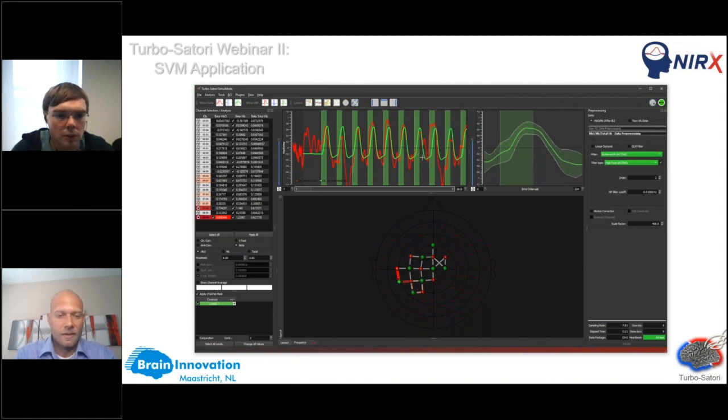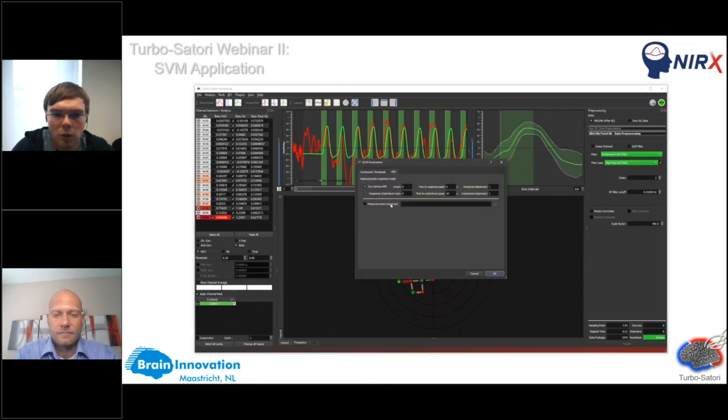Okay, thank you. So the last question, it looks like: could you show again how to use the individual hemodynamic functions as my GLM basis function? Yeah, so the main idea of this was to have a specific time course. So this option requests the measured mean response.